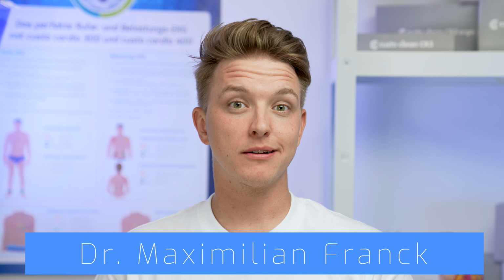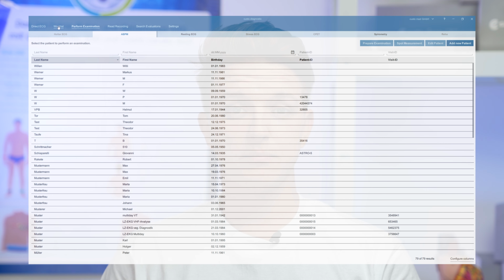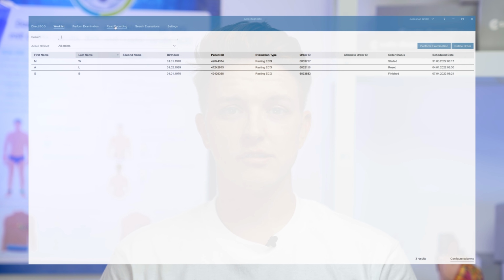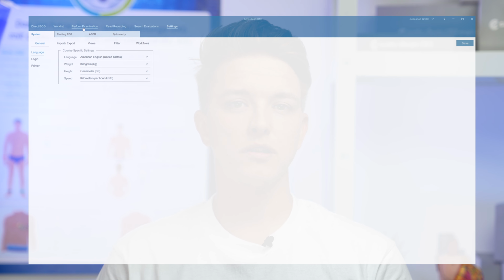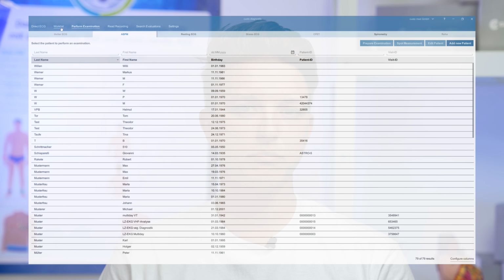Today I would like to give you a closer look at the ABPM module in the new Custo diagnostic client. If you open the client for the first time, you will already see all functions and options that are now available to you directly. That means you can select work list, perform an examination or look for a report right away. For the purpose of this video, let's assume you already have a recording of a patient and you just want to look at the report.